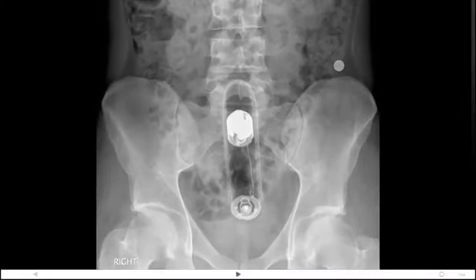And finally, very few surgical nights are complete without at least one admission with a foreign body per rectum, and this film is surprisingly common in accident and emergency, and we can clearly see the presence of a foreign body within the pelvis and likely to be lying within the rectum.